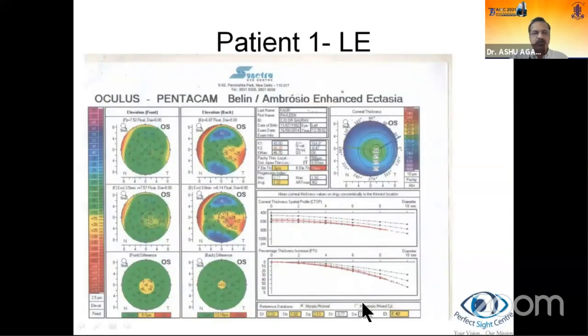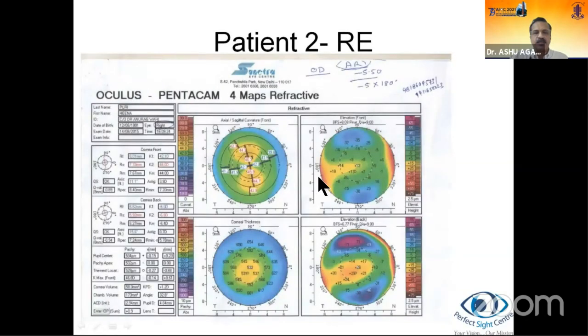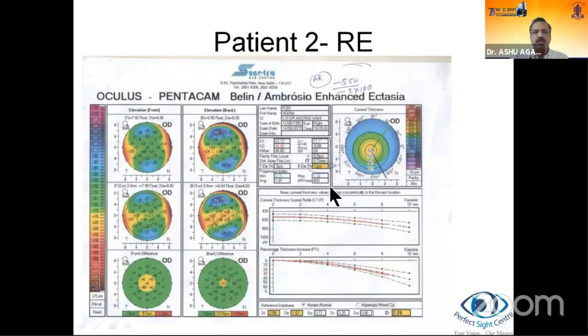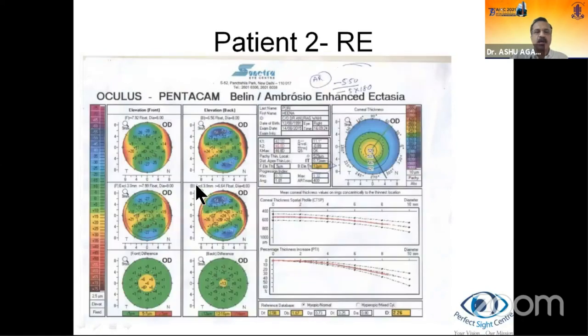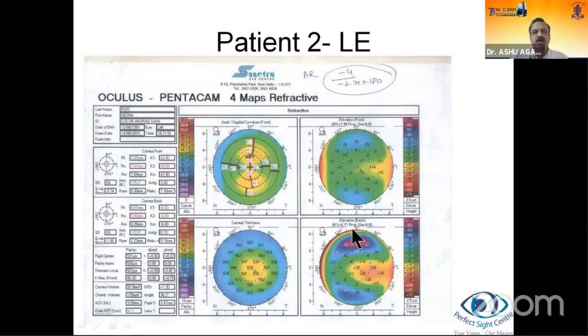Here also similar features. The other eye of the same patient, the ART max is 362, so is suspicious. And similarly in this patient, you could observe the ART max is 400. And this is, if you notice, a very high astigmatism, and that could probably account for it. So we still haven't got over high astigmatism because sometimes they mimic these changes in the corneas.